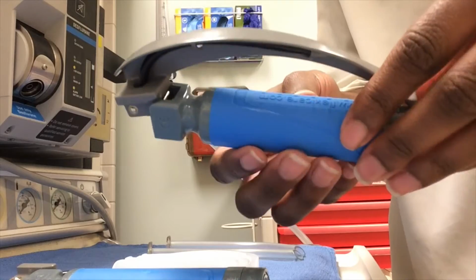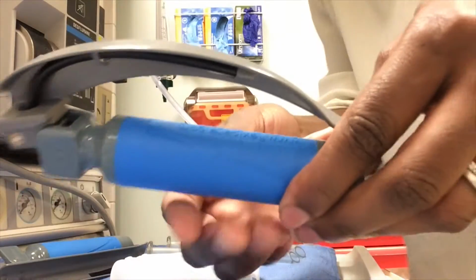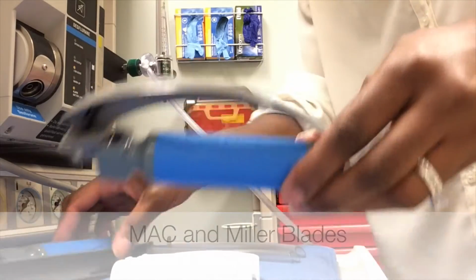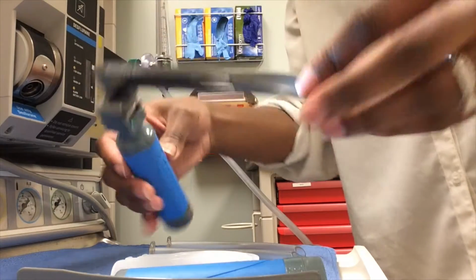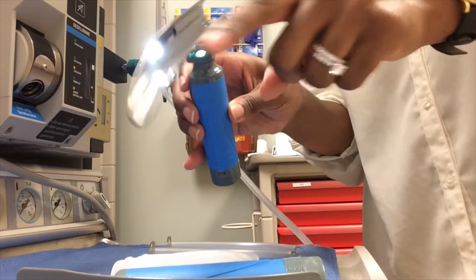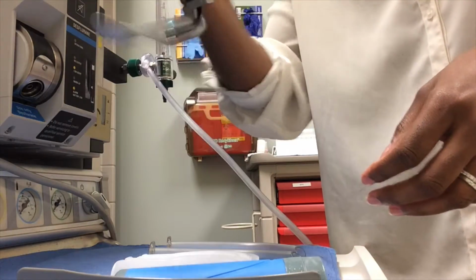One of the first things I'm going to show you are these blades. We have two different kinds. This is a Mac blade, and you can remember that because it's curved. And this is a Miller. It's straight, two L's. And one thing you notice is it has a light right there so that you can see when you're intubating. And you hold it like this.